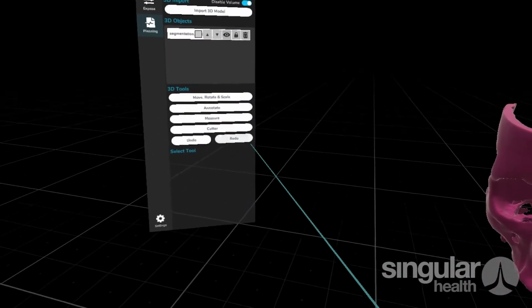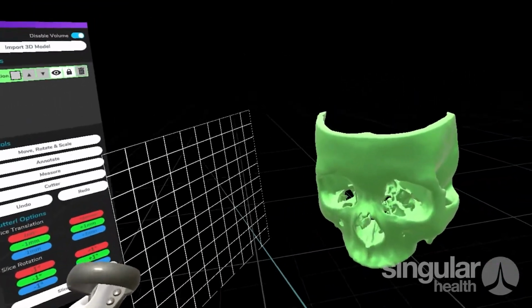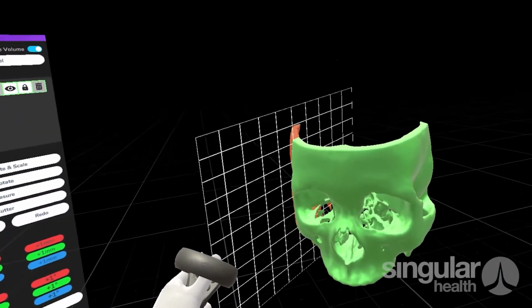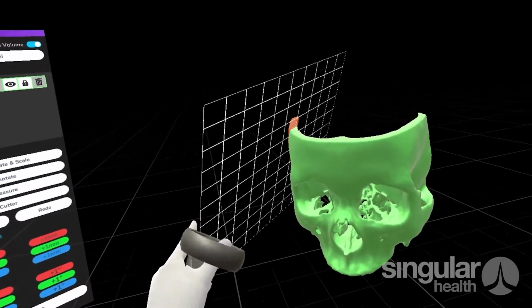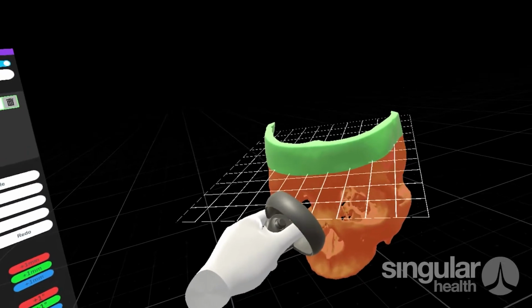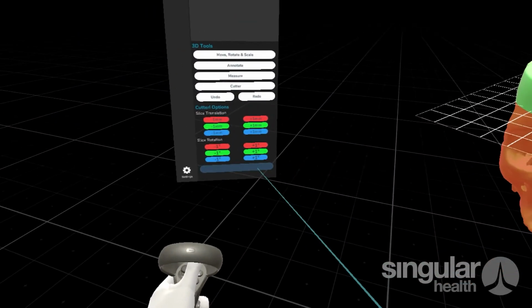So finally we have the cutting tool. The cutting tool lets us slice a mesh. Everything is done locally in this system, so nothing is sent online or sent abroad. For this purpose we'll do a pretty extreme cut. Let's say we'll just cut directly down here. And we'll give it a slice.